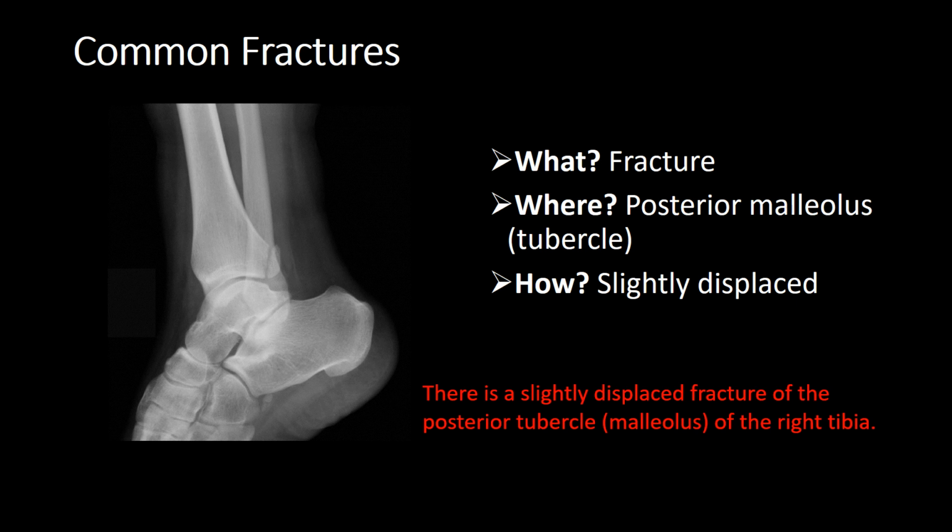So what is it? It's a fracture where it's the posterior malleolus or tubercle, how, slightly displaced.